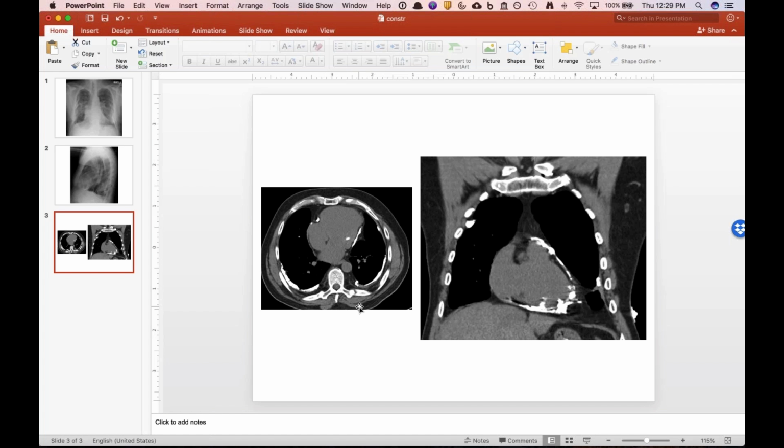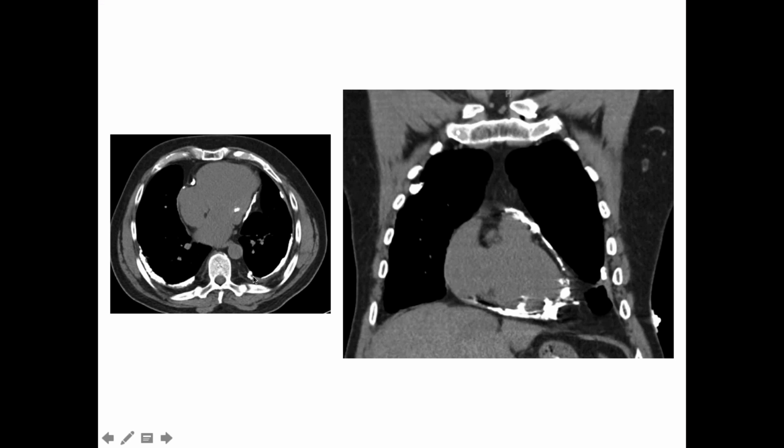So I would call that diffuse pericardial calcification and not really plaque. Yeah, the pleura is not discrete plaques. There's a lot of diffuse calcification, thickening of the pleura and calcium. The pleura looks like plaques. I mean, you have soft tissue and then you have areas of calcification as well. And this guy had an asbestos exposure, but.